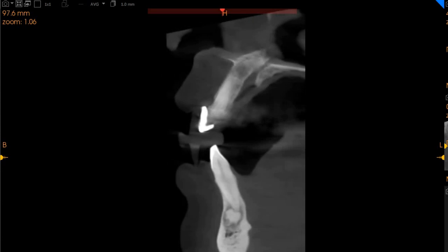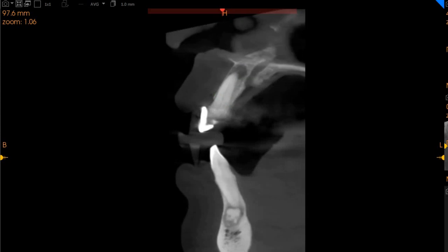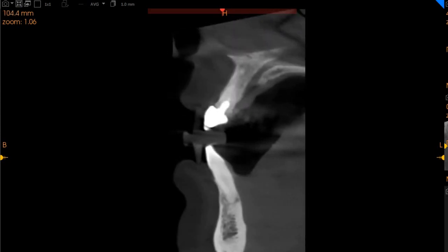This is the region of the central incisor. The central incisor again has no endodontic treatment, severe periapical radiolucency, very thin buccal cortical plate, 6 millimeters of width with approximately 15 millimeters of height. Again, extraction and graft is the ideal scenario for the upper right central and lateral.